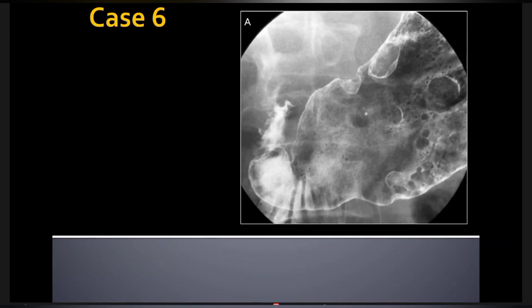Good. So if you have an ulcer crater, what happens to the contrast in the picture? It will not be filled. It will fill, yeah? It will fill, because a crater is a dent, isn't it, by definition? The crater will fill with contrast, but the surrounding will be radiolucent, like a halo mound around it, an ulcer mound. Correct. And a contrast crater within it. Absolutely. Spot on. So is this what you're seeing here?